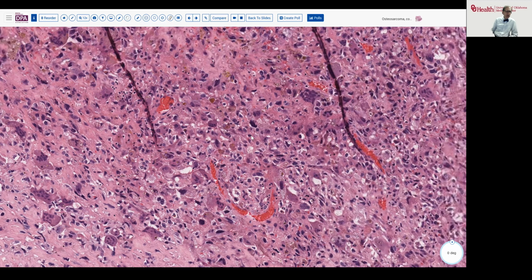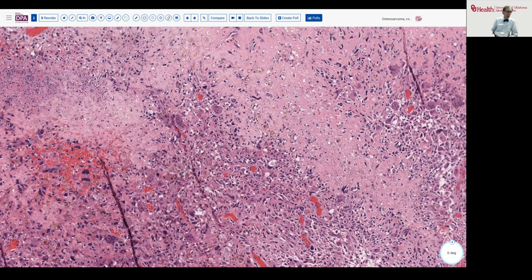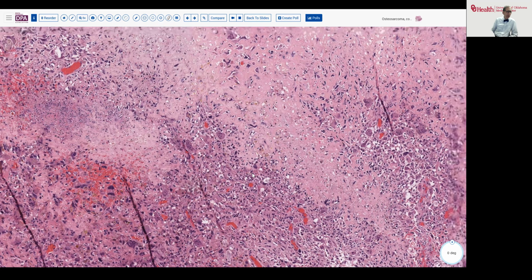So one of the challenges, of course, here is defining the nature of the tumor, and osteosarcomas can have variable degrees of ossification. We know from the radiograph that this is not a very pronounced ossifying tumor, but I think we can see that there's enough of this material here that suggests osteoid with central atypical cells that the classification as osteosarcoma is established from this sample.